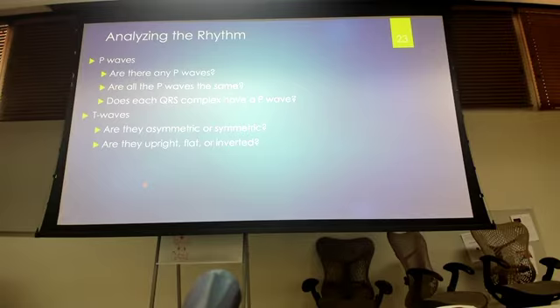The T wave will often follow whatever is taller or deeper. So in V1 and V2, if your S wave is deeper, it is not unusual to have an inverted T wave. It's going to follow that QRS complex, whatever is taller or deeper. We want to look at those T waves.